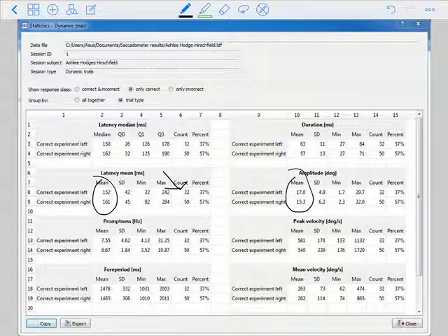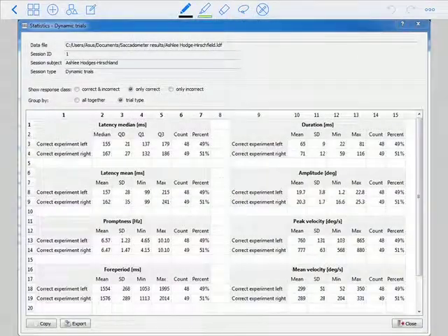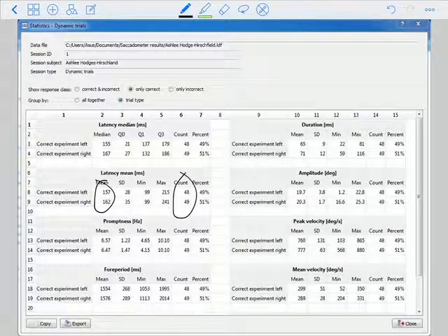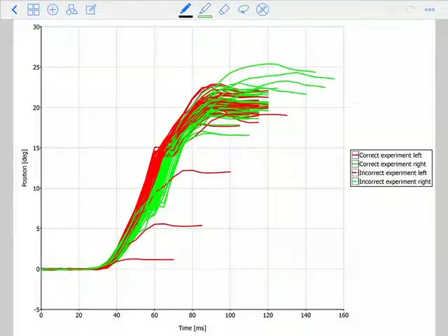So we worked with her for 4 days, and let's take a look at her post numbers first. Did a lot of parietal work and collicular mapping, and still good on the latencies. Numbers have come up, certainly by a great deal, so they're a little more even, and the amplitude has certainly improved. This is what the graph will look like. We can still see some scattered right saccades here, or glissades, so we may see some cerebellar issues there.